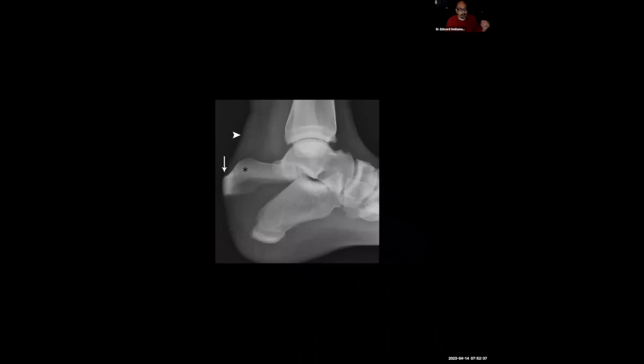So here, just to provide a nice example of the tongue-type fracture, this accounts for about a quarter of intra-articular fractures. And management of these tongue-type fractures is very important, because notice here the posterior subtalar joint involvement, and this fracture fragment is pulled up. What I want you to notice here, and we can feel the back of our hindfoot, is that sparse glabrous skin posteriorly. If not reduced initially, this can lead to pressure necrosis, and this closed fracture can become an open fracture. That's why it's important to initially reduce and fix, and then wait for the soft tissues to settle down.